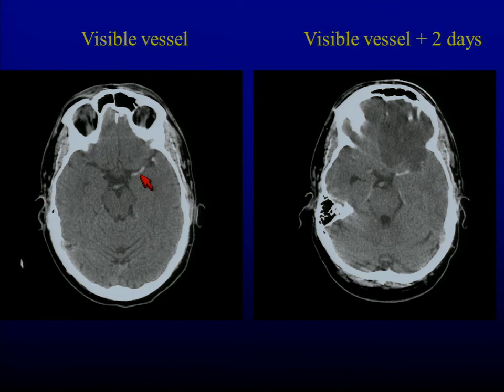Visible vessel. If you're in a shop that does interventional radiology, or you send to a place that does interventional radiology, there's a lot of research going on right now about what to do with a visible vessel. Is it going to get better with IV TPA? In our shop, we have a very aggressive IR group, and these patients, while we give them IV TPA, we almost immediately activate an IR pathway in order to give them intra-arterial TPA with the visible vessel. But blood is bright white when it clots. Doesn't matter if it's in a vessel or out of a vessel. If it's clotted, it's bright white. So this is just the middle cerebral artery, right where we expect it to be with blood. And this is, if you don't get it canalized, which this person did not, what you expect the outcome to be.